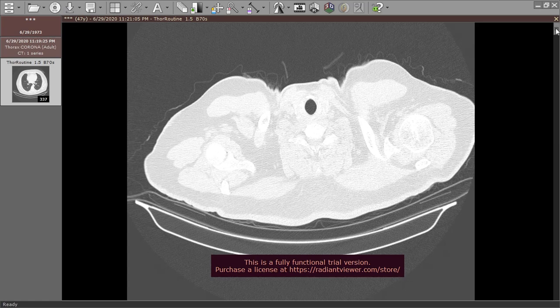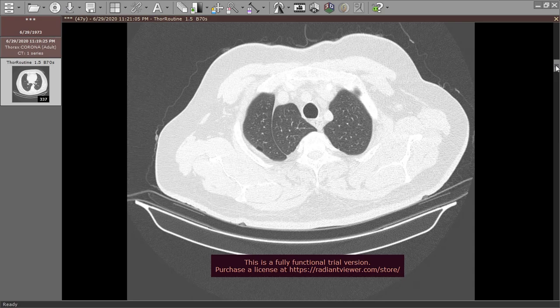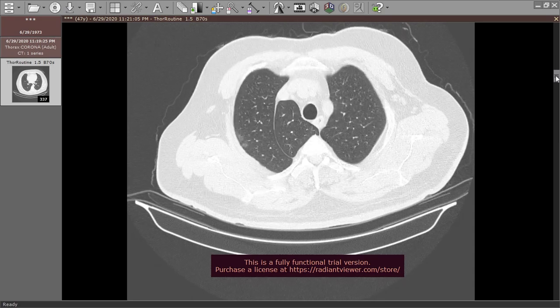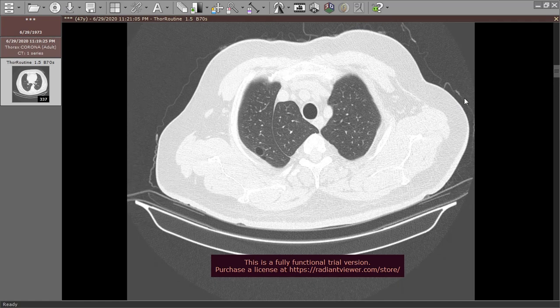Case number 2. We start first by the lung window again. By the way, this is what's called the azygous fissure, the site of crossing of the azygous vein towards the superior vena cava. And there is a small pneumatocele at the first of the case.